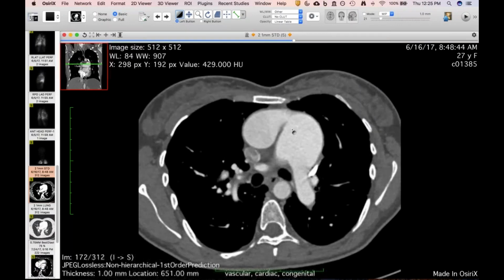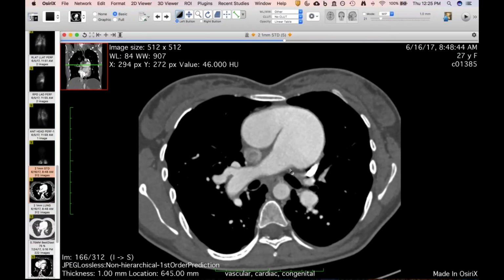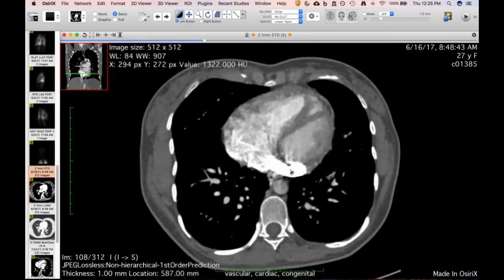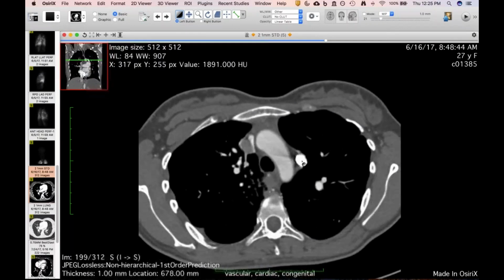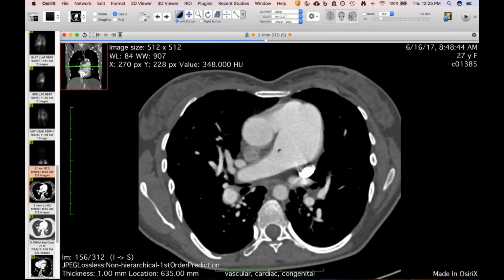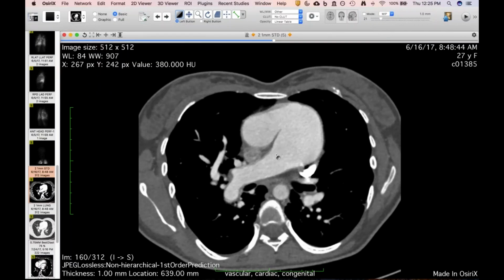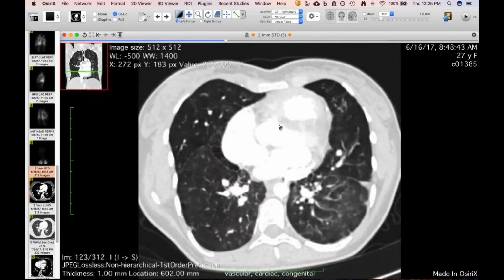And so this accounts for why the main pulmonary artery looked so large with this large AP window. And then she also has duplicated superior vena cava, and she was injected through the left upper extremity, as you can see here. So of course, this is the rarest of the rare in terms of congenital shunt lesions, usually recognized in young kids at the time of birth. But she's an adult and she's reasonably functioning.